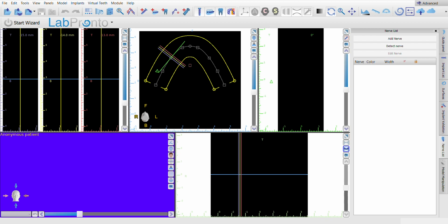So that's that. And so I have the Blue Sky Bio Planner. I open it up, and now we want to go ahead and bring our first case in here. In order to bring the case in, you come into this file over here. It says start from patient CT scan, which is the DICOM images that I have in the computer. So I click on it and a window opens up, and it just happened to be on this particular patient that we're going to work on. A window opens up, look for the folder where the DICOM image is.